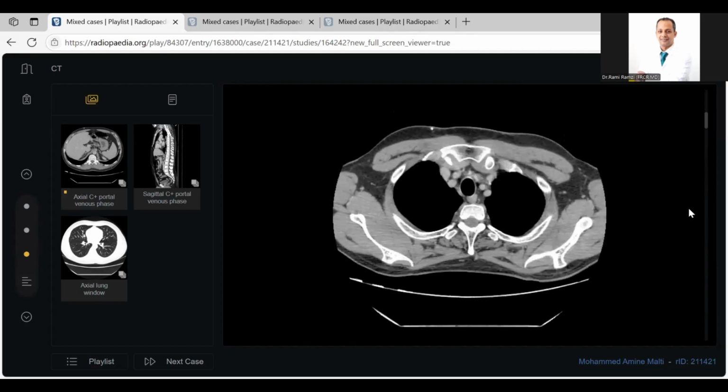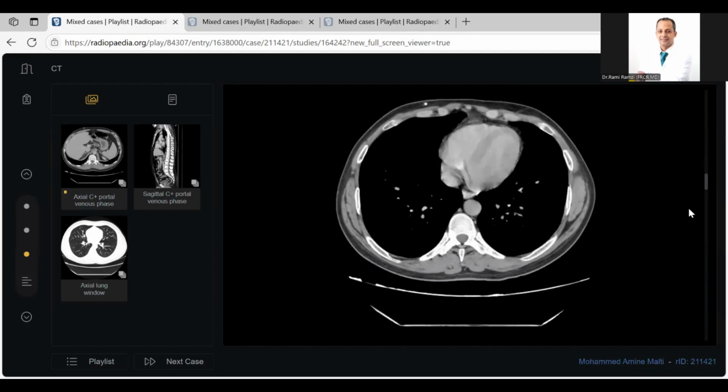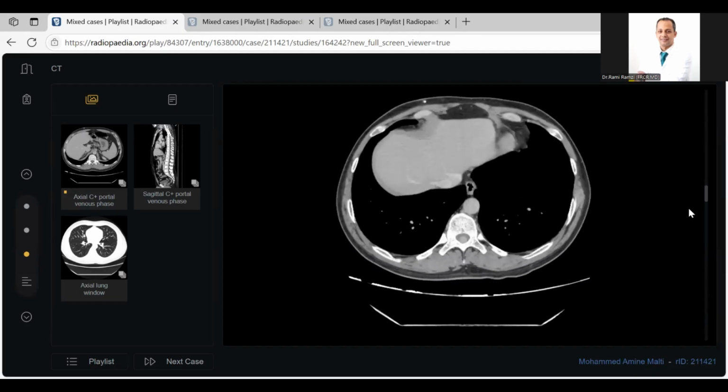Before seeing the MRI brain, there are very important findings here. In a von Hippel-Lindau patient, you picked up most of the findings, except the last one. Yes, so can you please scroll? There can be multiple. Concentrate on this slide.